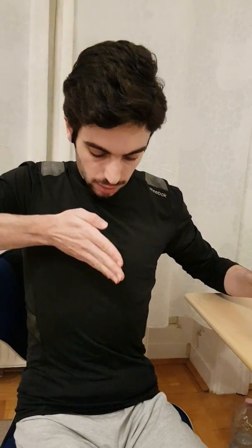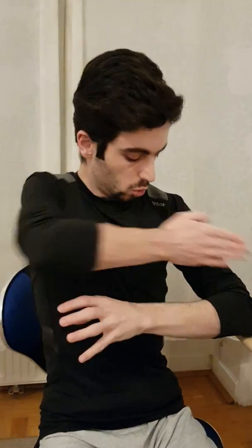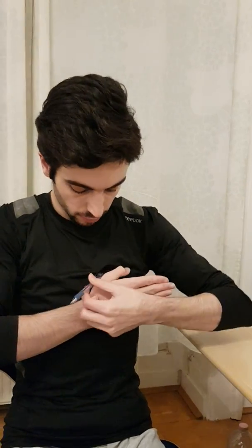So this is the direction of the right atrial depolarization, and this is V1. It's with it. It's not against it. It's kind of with it. So that's why we see it as a positive wave. And then to the left, it goes that way, because it starts from here, as we said, from the SA node, and goes towards the left. So it's like this. And then there's the V1.